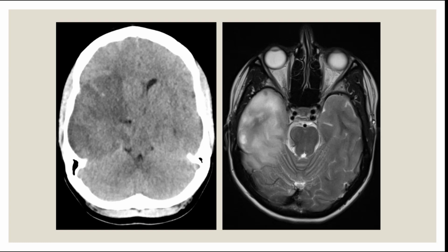This is important to say. Okay, it is a native CT because we can't really see the vessels. So it's a native CT, hypodense lesion, there is edema, we cannot see the ventricles.